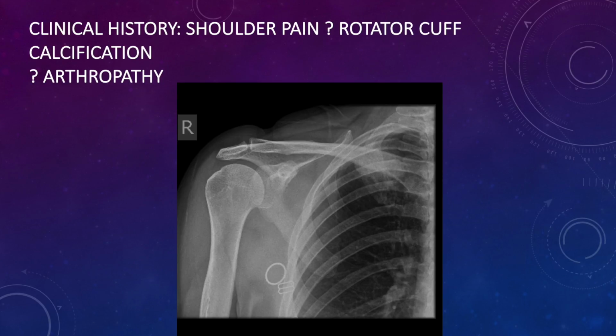Okay, we have this clinical history: shoulder pain, question mark rotator cuff calcification, question mark arthropathy. That's straight off the request card. Shoulder film. Now you must be comfortable. This is MSK. You're back in your comfort zone. Happy days.